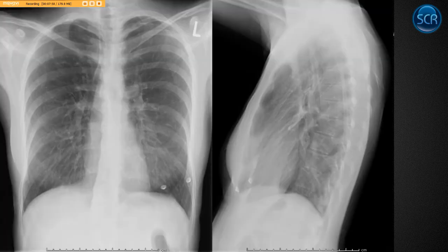It's too easy. What's more common is a situation where we have a chest radiograph and we see this kind of edge here, right? Which is crossing the ribs. It's not going along with the ribs. This is the visceral pleura. And there's free air up here, right? So here's this crescent of free air. So this is something you specifically want to look for. So you look at the apices, okay, no mass. But you look at them again, okay, you see some thin little vessels coming up here. There's some density here. There's lung tissue. No lung tissue right here. This is free air outside the lung.